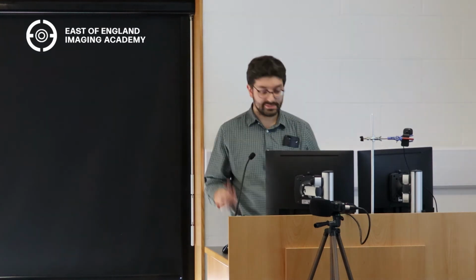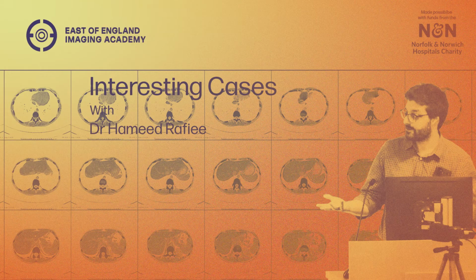I appreciate that at this stage, a lot of you will be like, oh, I wouldn't ever think of things like that. But this is what comes with radiology training. So this is why it takes 5 years to train up as a radiologist. So let's have a look at something else. Let's have a look at this.